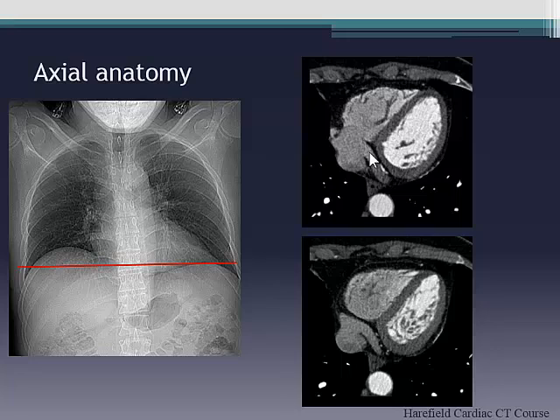But more importantly, as those of you from an echo background, you're used to looking at the three-chamber, you're used to looking at the four-chamber, and you identify the relationships as to whether they're normal or abnormal. So it's a really useful skill because it forces you to look at the image as if you were looking at an echo. And similarly, if you're from an MR background, it will get the 3D anatomy sorted in your head and also force you to look at it in the same way. So, for example, if you do a 2-chamber, you'll see the coronary sinus right up against the left atrium.